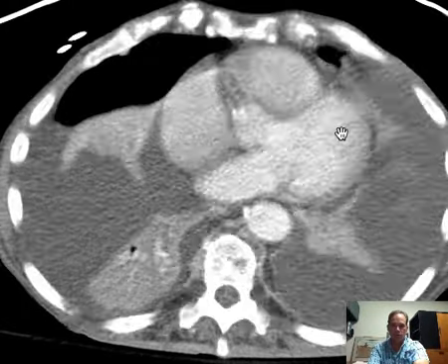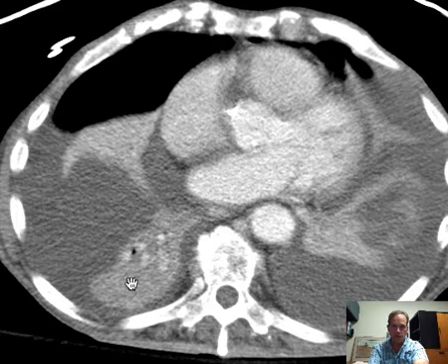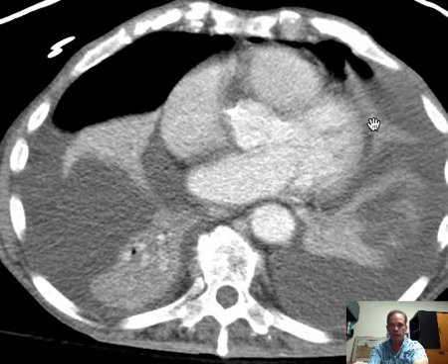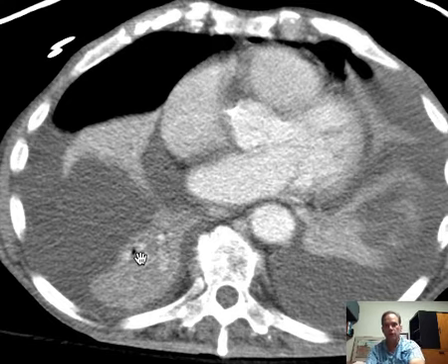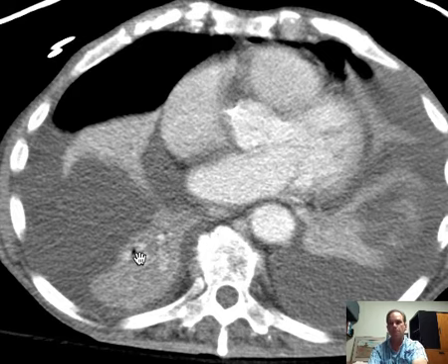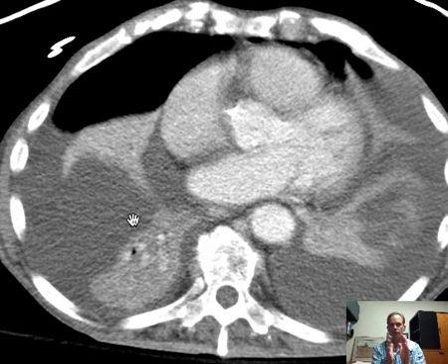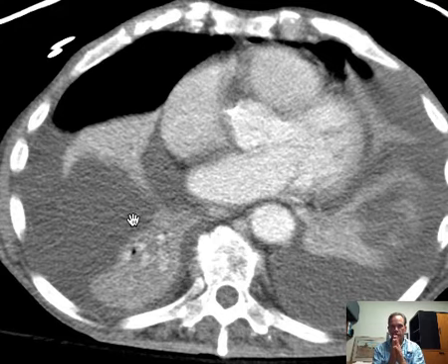Well, first of all, this is lung tissue here, this is lung here, and this is lung there as well. So these areas are not aerated. So you have areas of non-aerated lung on both sides. Just a simple little descriptor to summarize what we're seeing. Why is that? The fluid around the lung has accumulated to such extent that it is compressing the lung, pushing the air out of it, and thereby creating what we call atelectasis, or volume loss.